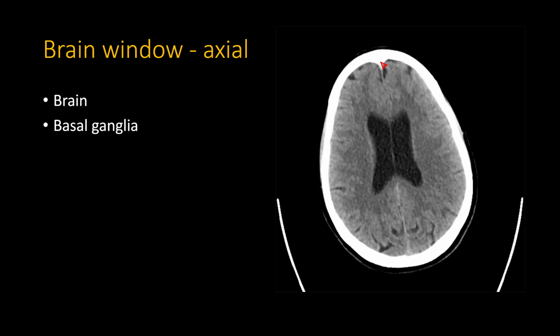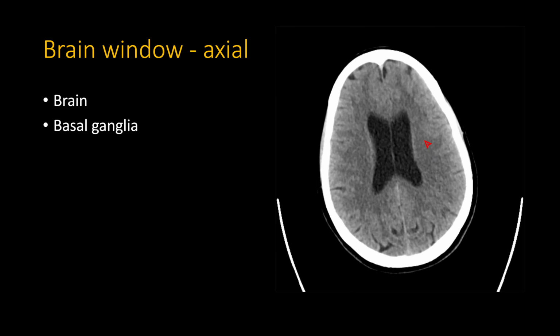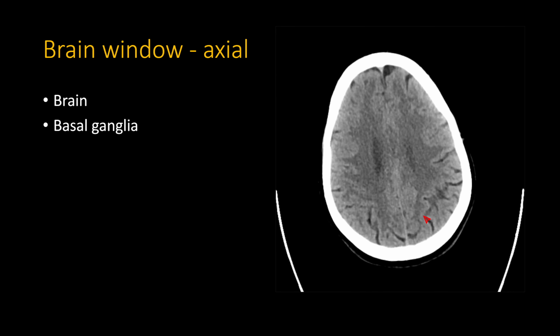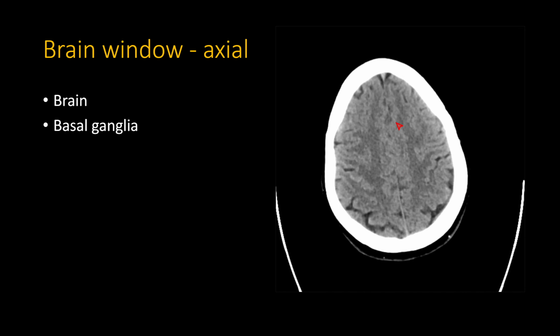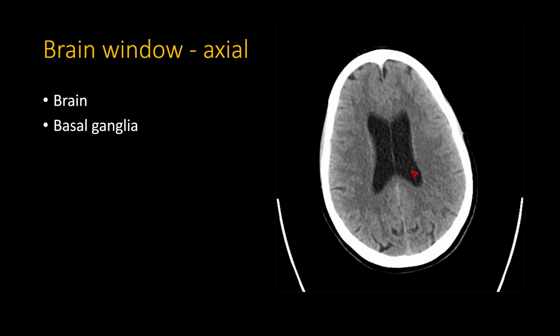Here, as you can see, if you go by the midline of the calvarium, the septum pellucidum is right smack there, so there's no midline shift. As far as gray-white matter junction differentiation, again, these are nice sharper brain windows, so you look there and make sure that they're all preserved, including the medial gray matter. A lot of times you might forget to look at the medial gray matter right here, if you just focus on the lateral hemispheres.